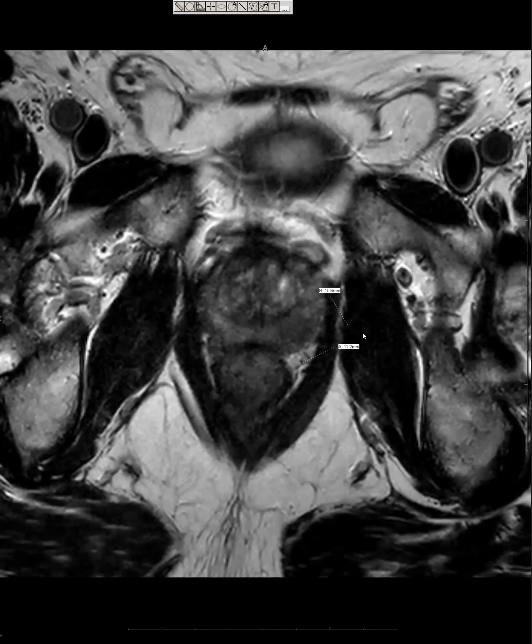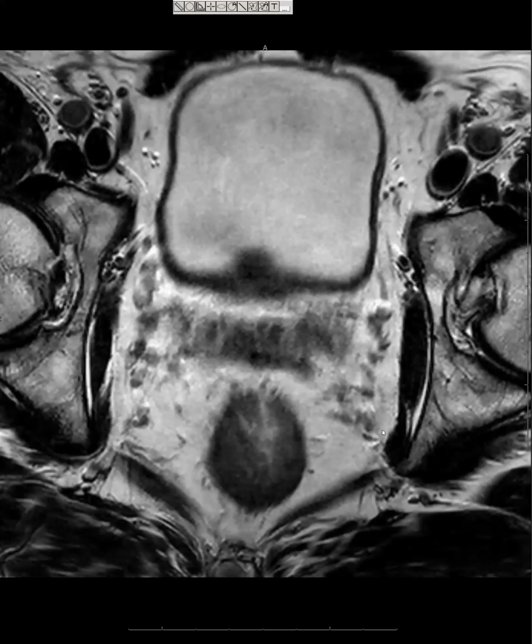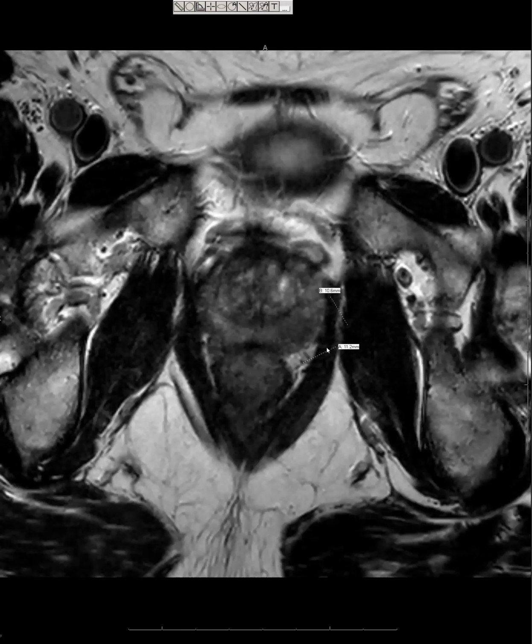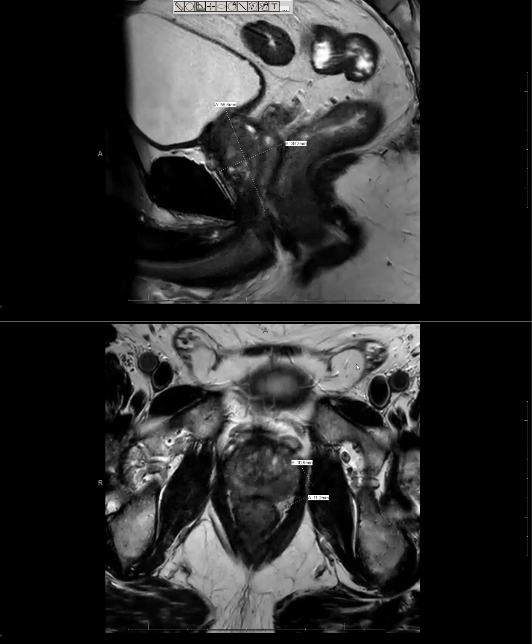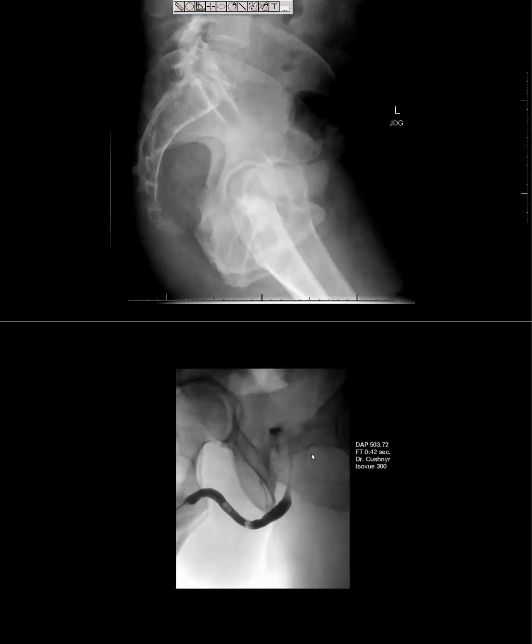One of the things you're going to look for in these is reasons why they wouldn't want to do surgery. And we didn't see one. It was a pretty smooth margin, and I think he ended up having a robotic prostatectomy with a wider dissection around that left side, because that was the only lesion. Surgery was somewhere between 8 and 11 months before, but 4 months later he was having some urinary symptoms, and so had a retrograde study.